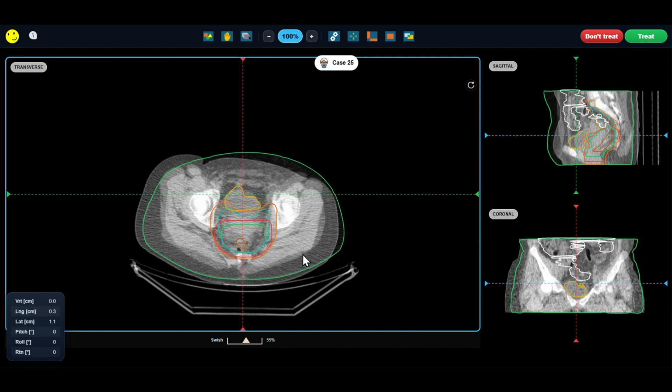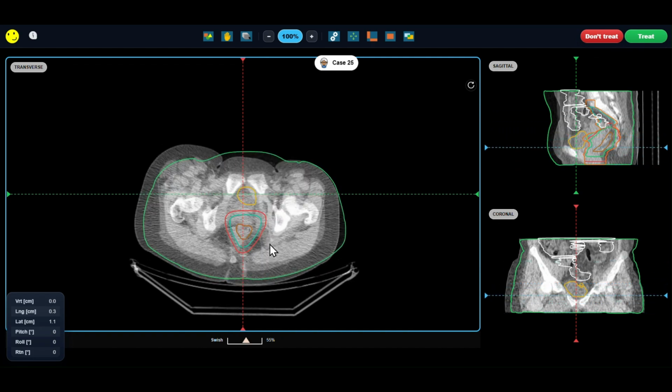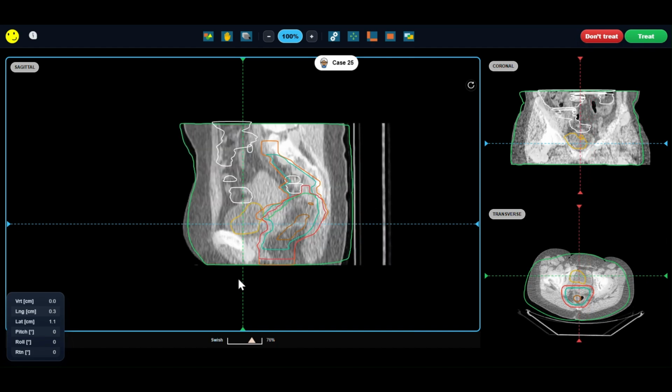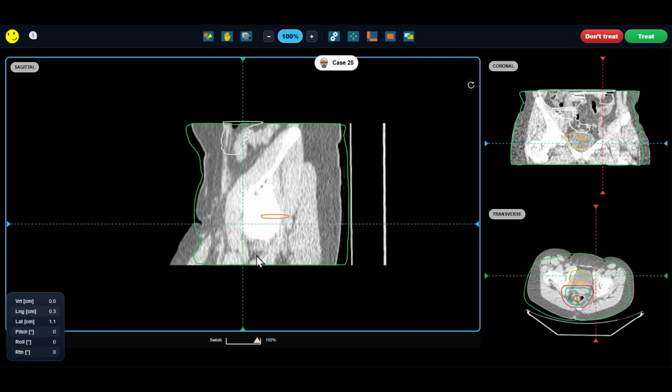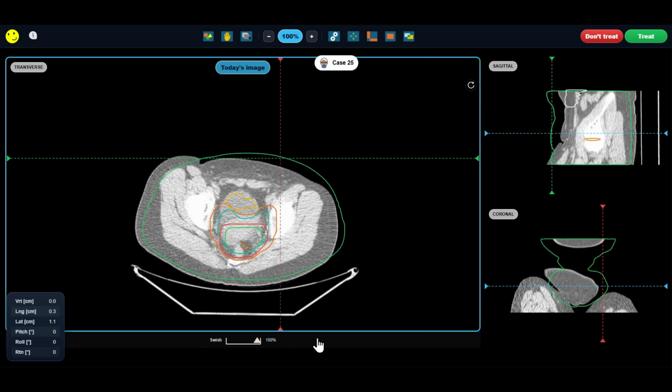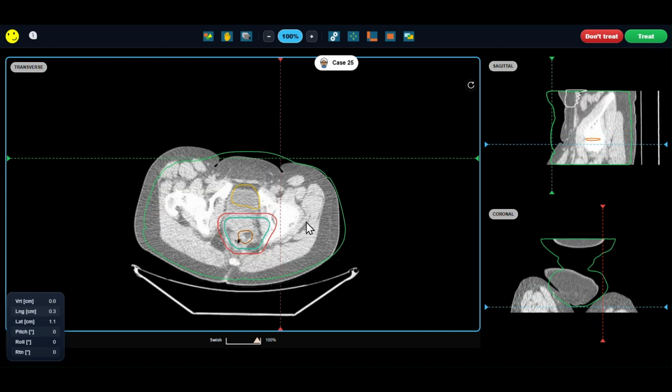Now this is a really useful case for students because it shows that image matching is not only about lining images together visually, but it's all about clinical decision making. So in other words, we are not only asking, do these images look similar, but also asking, is this patient in a safe and acceptable position to receive radiotherapy treatment today?